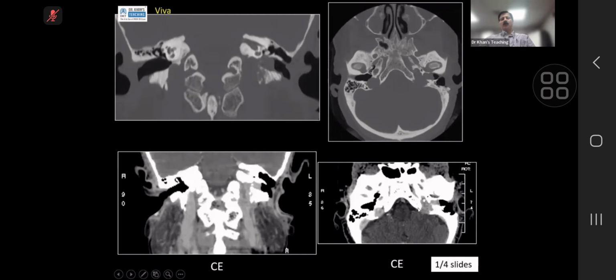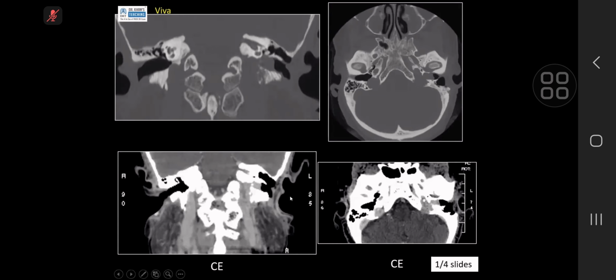But yes, you are right that it is also involving the jugular foramen. We are just debating the word to use. It is from the jugular foramen, it is going into the middle ear cavity. So this type of glomus tumor is known as glomus jugulotympanicum. Are you with me? Yes.